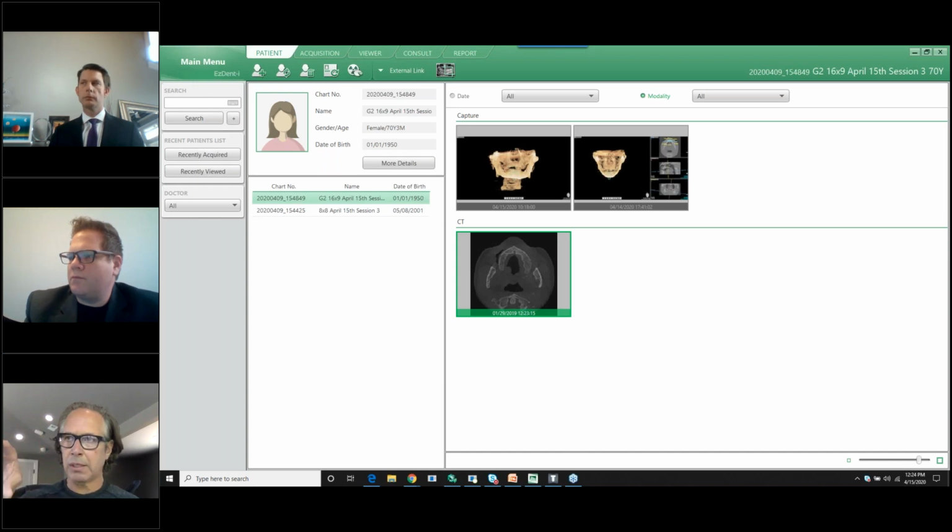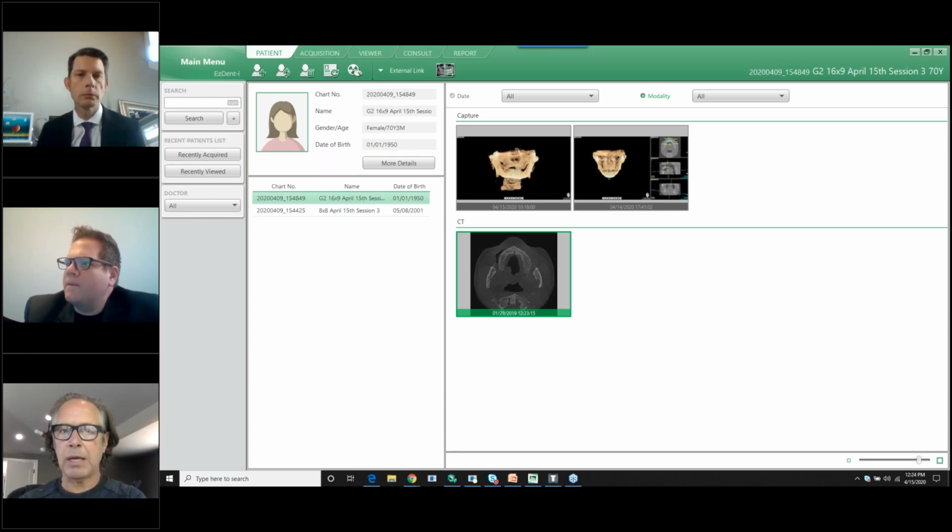It's when you take the STL, stereolithography file, and the CBCT DICOM file set, and you merge them. That merge has to be impeccably clean, and it has to superimpose within hundreds of microns. If it doesn't, your guide will fit the mouth, and everything will fit in the guide in terms of the drills. But when you drill it and place your implant, it will not be where you designed it, and you won't know because the guide fits perfectly. That's the example I gave in my case.